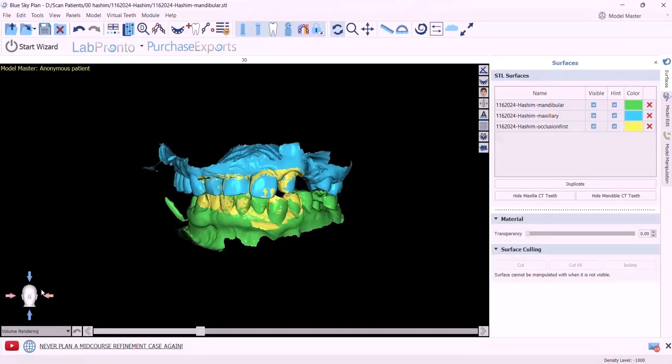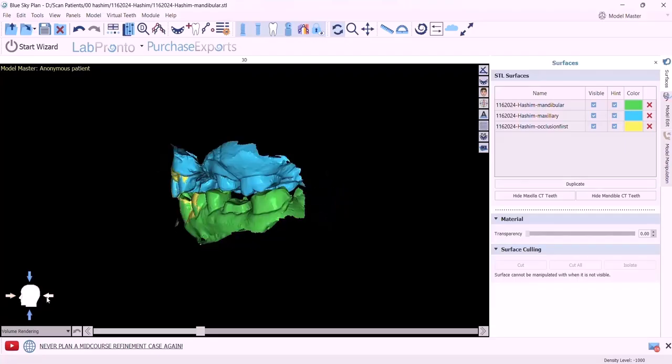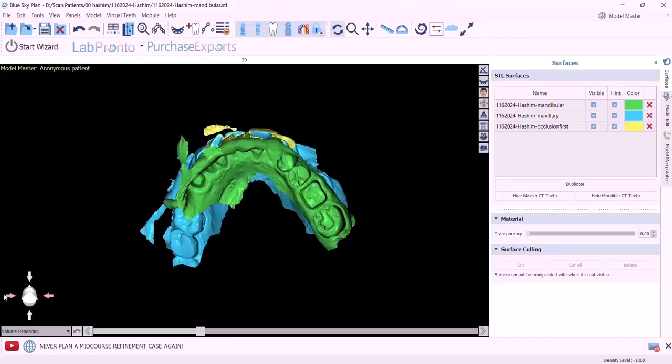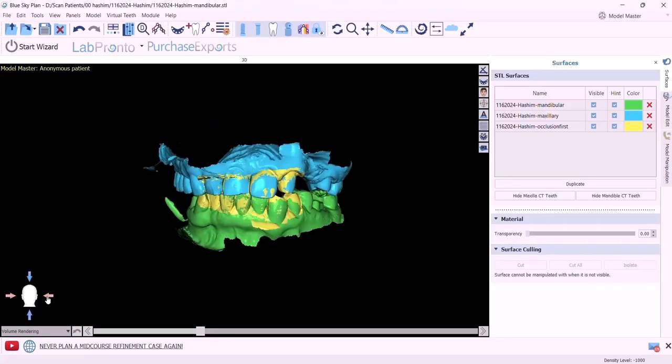Now, this is the window of the main program. It has the viewport, which has all the data that we imported, and it has this model down here, which has these arrows. If we press on them, they will indicate the direction of view. So it could be anterior, posterior, sideways.